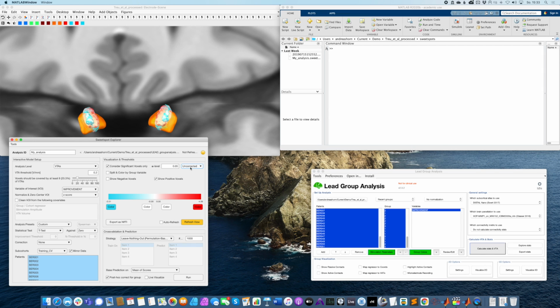that rarely can we simply correct for multiple comparisons, and it even gets more complicated because, as mentioned in the beginning, not every voxel will be covered by the same amount of VTAs. Right, so probably you will nearly never find anything with the correction strategies in here, right? But what you could do maybe to just look at the uncorrected significant clusters is to run this.